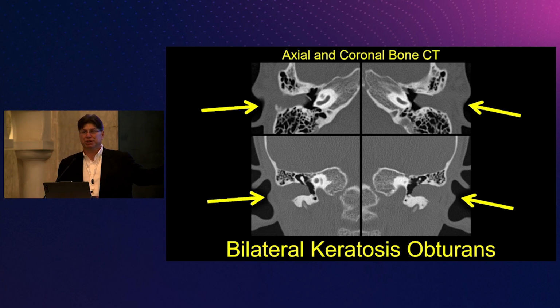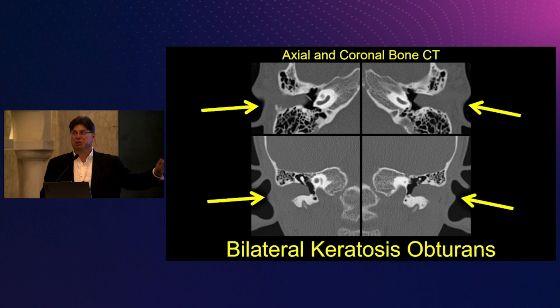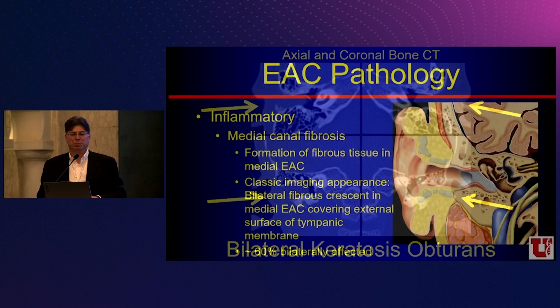I have this CT scanner, it's just a big, stupid densitometer. I'm just looking at densities of stuff. There's some soft tissue that's filling the EAC. So that explains to me why those sound waves are not getting through the tympanic membrane.